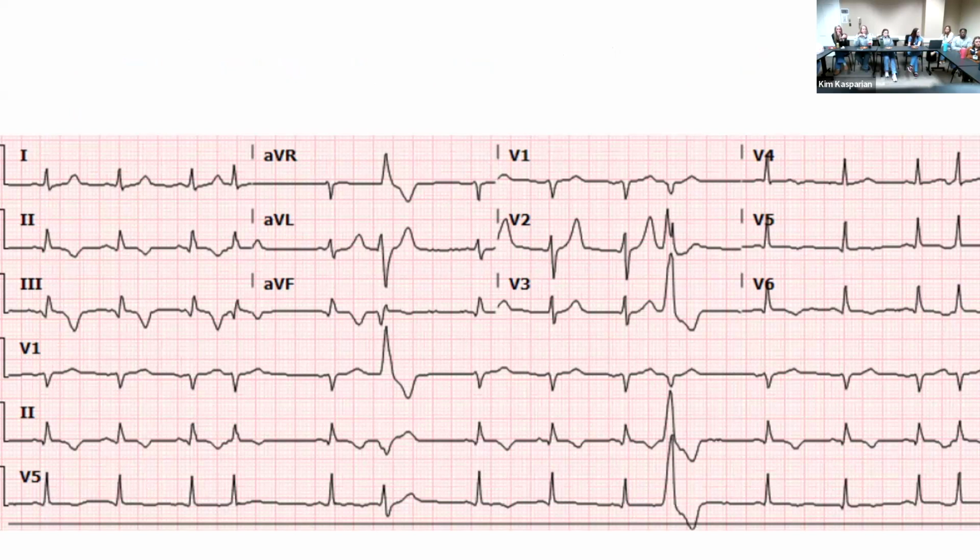Yeah, definitely some T-wave inversions in 2, 3, AVF, right? And there's some flattening in the lateral and apical leads. And what else do you notice that's new? Yeah, so he's having some PVCs. So yeah, there are our T-wave inversions that are new.